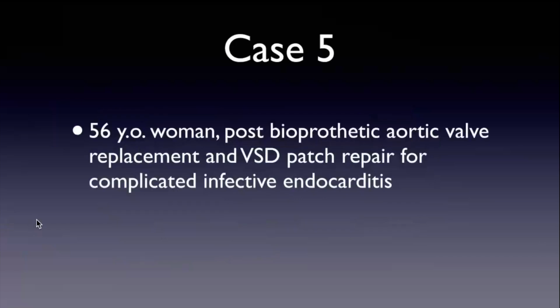Okay. Then to finish up with a couple of valve cases. So yes, to kind of wrap up that case, what do you think it actually is? Maybe embolic ischemic? That whole thing? I'm just curious. Yeah, so I don't think we can say for sure. Having said that, I don't think the treatment would differ too much.